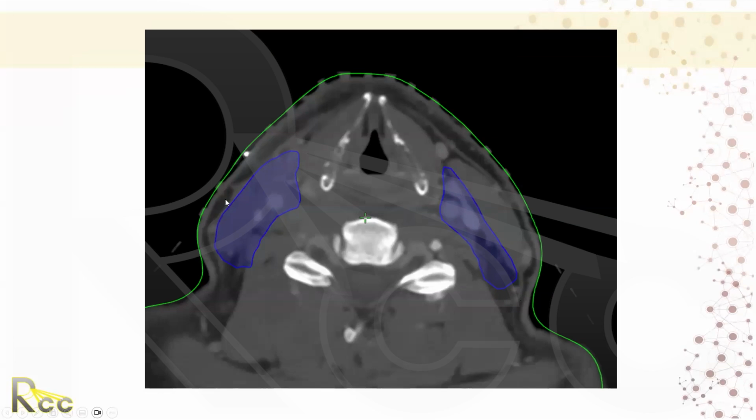The neck is dissected and has lymph node positive disease. Many people would cover the entire sternocleidomastoid muscle and the lateral border because this has now been surgically disrupted. You'll notice some people would vary. They said if there were well encapsulated small lymph nodes, maybe I'm just covering the medial half of the sternocleidomastoid muscle. Medial half meaning just this half right here. But if I have extranodal extension or a significant bulk of disease, then I'm concerned about microscopic disease infiltrating the sternocleidomastoid muscle, so you treat the entire muscle. What is the risk of this? The main one is going to be lymphedema. After neck dissection and treating the entire sternocleidomastoid muscle, you're going to have more superficial dose to the neck, and you're going to have a little more lymphedema.